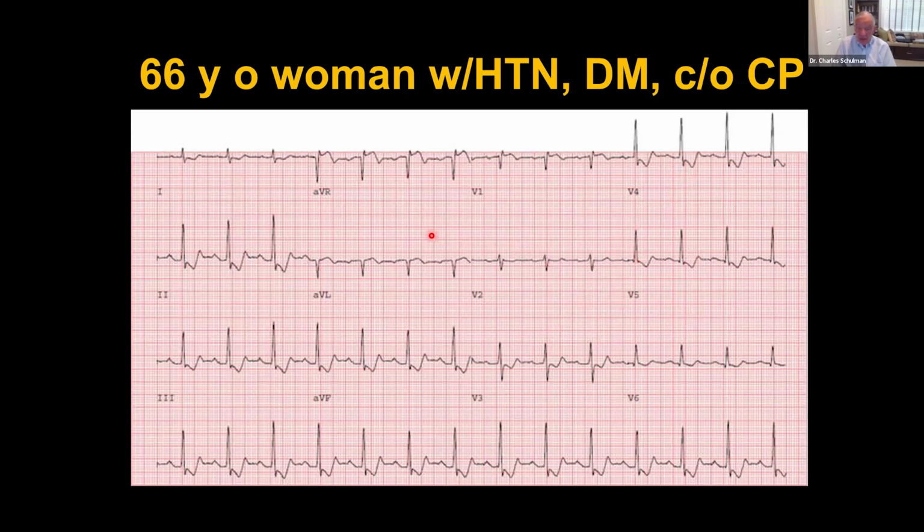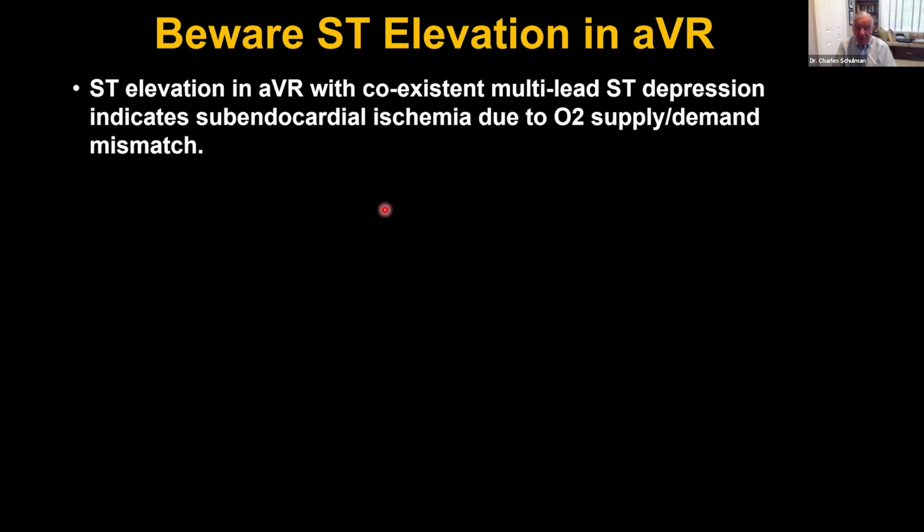But she's also got a telltale sign of ST elevation in lead AVR. Okay, ST elevation in lead AVR. Beware ST elevation in AVR.